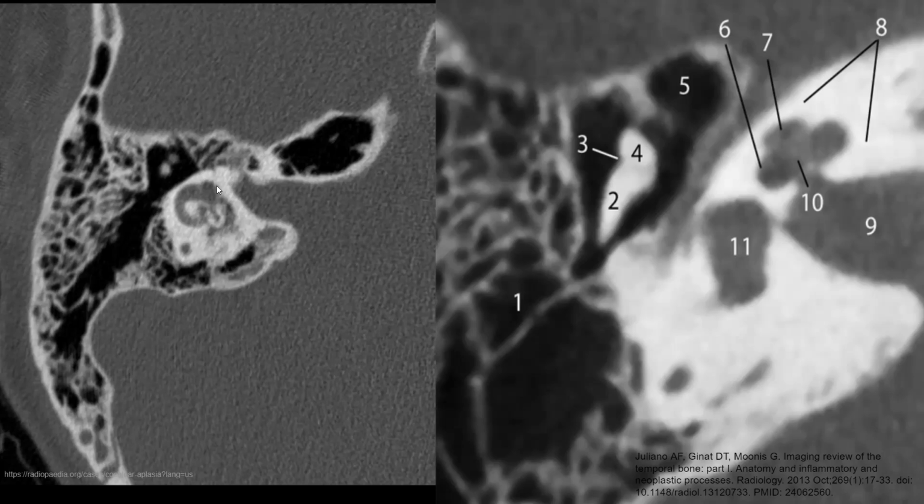When you really study this and spend time with it, you'll realize that there are not very many structures to memorize, and once you do memorize them, it becomes really easy to notice pathology. I can look at this and notice that it's malformed, but I would encourage you to spend a lot of time looking at the normal structures. Again, it's not very many to know, right?